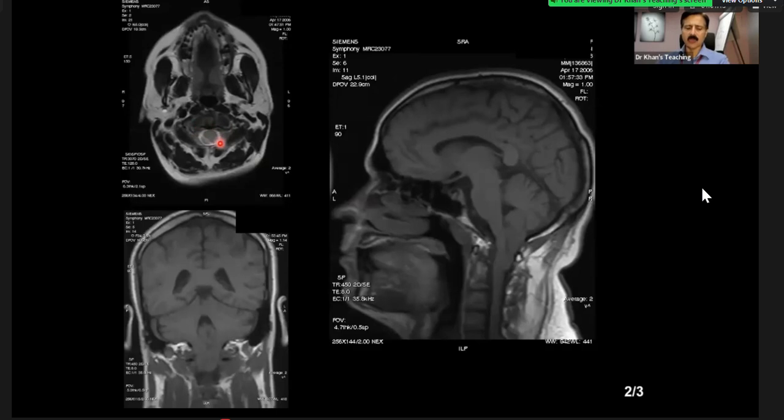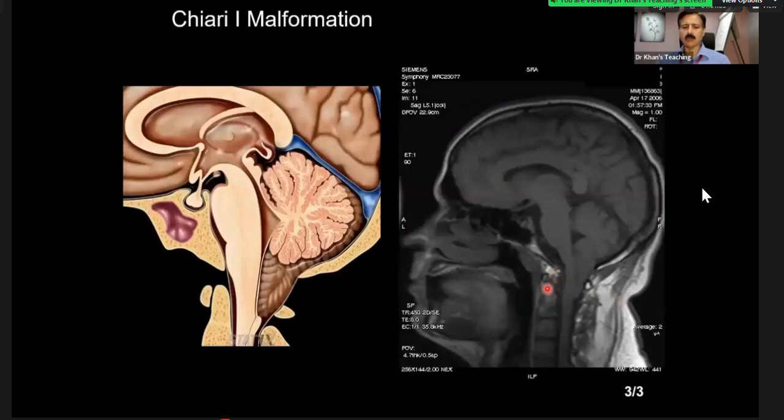And you have to develop your eyes to pick this up. Now, the learning point in Chiari 1 malformation is that I have seen it being overcalled so many times in our reports. Basically, the criterion is that if the tonsils are more than 5 millimeters below a line drawn in your brain across this portion of the bone.